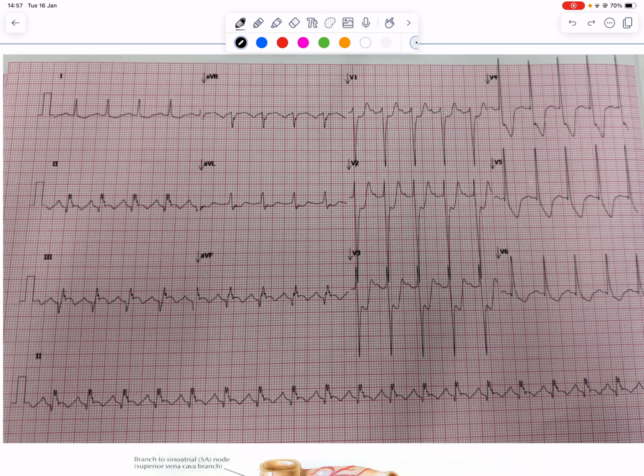So today I'll be talking about an ECG I came across in this past week. It was basically an elderly female that came in complaining of chest pain. When you look at this ECG, the first impression is, oh shit, what's going on here? Because it looks like there's a lot of things going on. So the goal today is just to try and simplify it and break down what is happening in this ECG and hopefully learn something from that.